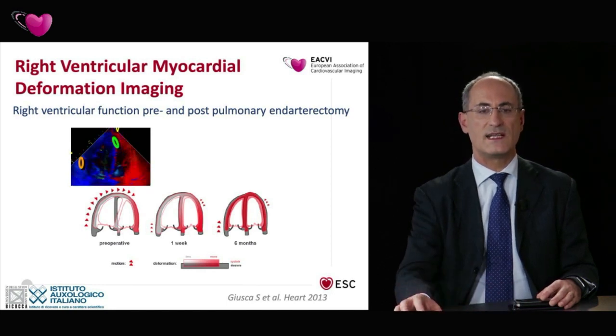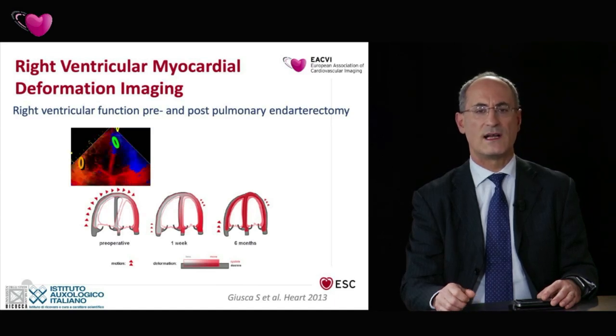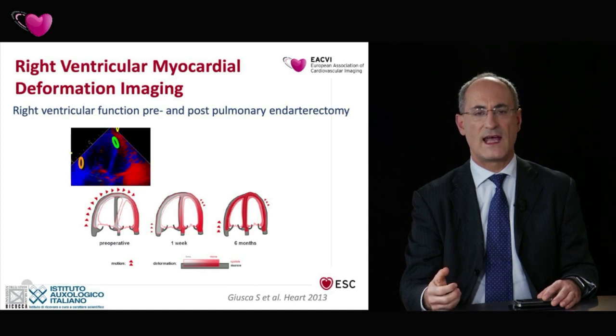You see that before the operation, there is a very small left ventricle that is actively contracting because it is empty and is tethering the right ventricle.